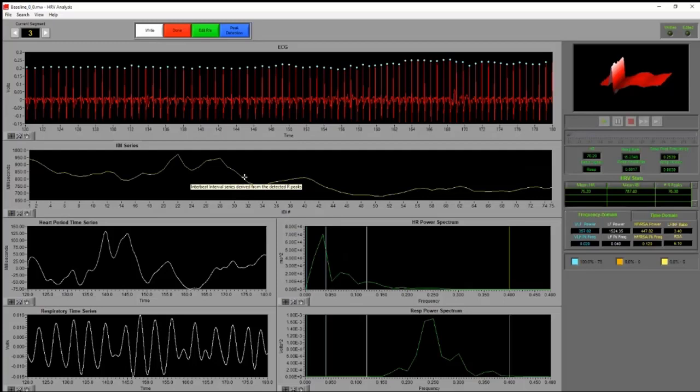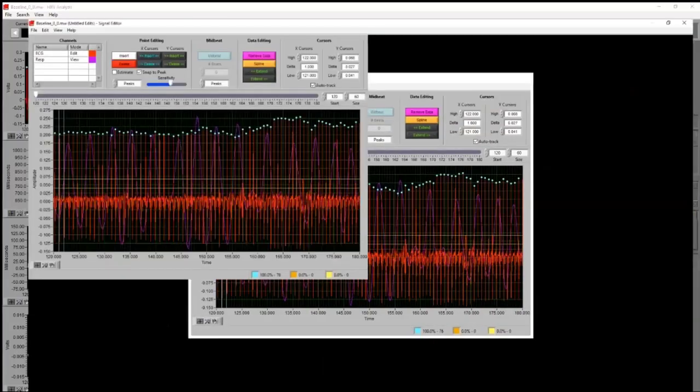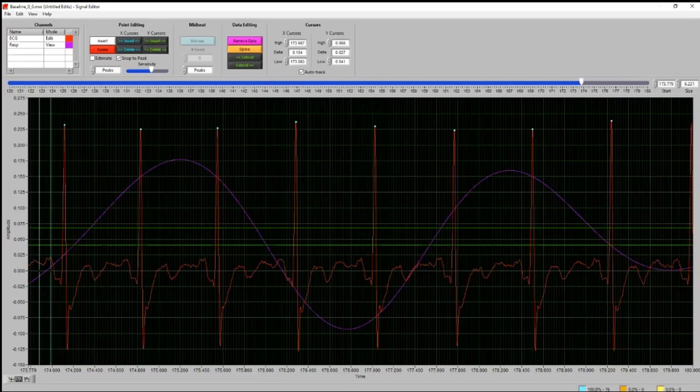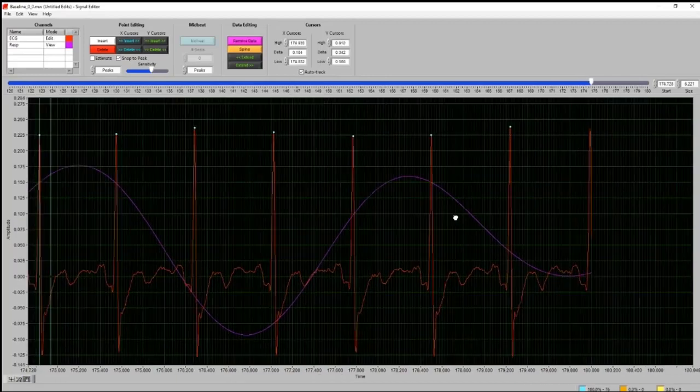It's not usually going to be worth your time to go in and add one beat when we have 76 other beats in this segment. But if we did want to, I'm all about the accuracy. We could certainly look in. Once we do that zooming procedure, you're going to get to the end of the window. So that's another really helpful reason to use that hand tool and click and drag through here.